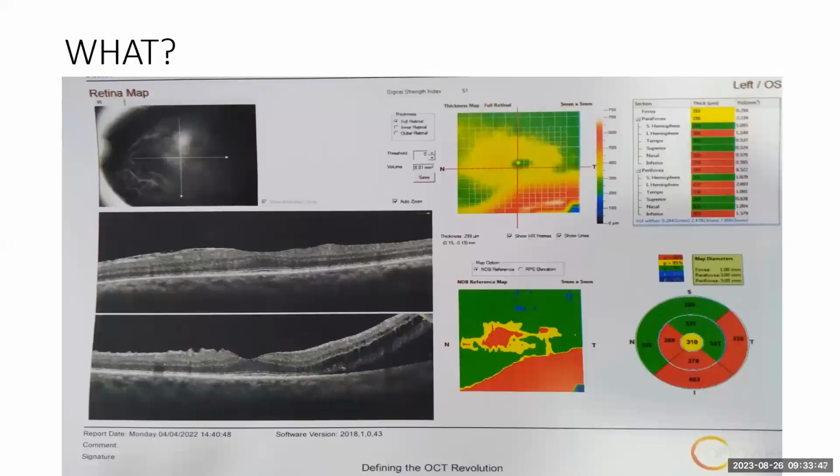Well, Dr., I can see that the central fovea, in the first scan that you are showing, has an alteration of the foveal depression. Okay, that's correct. So it's almost flattened. And if I can see very well inferiorly, there is a separation, a bit of elevation of the retina from the RPE, right?